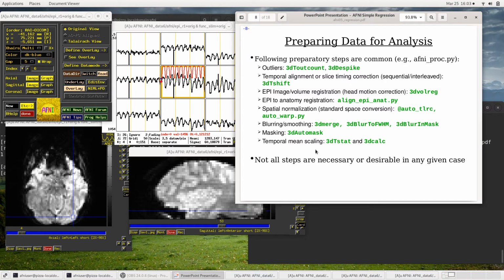And at that point, now the data are aligned and they're scaled to, you can call it a percent signal change or a percentage of the mean at this point in time. And now we'll be able to compare things across space and across subjects a little more reliably. And we'll cover more details for pre-processing in the start to finish class. But at this point, we just wanted to review the steps lightly.